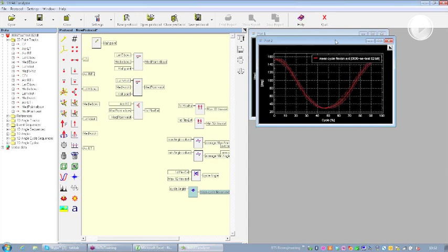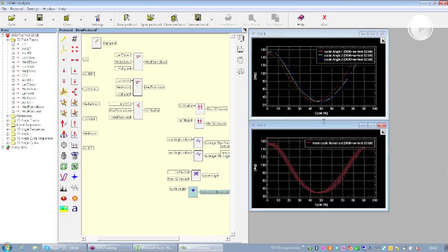That is going to be this. So the average cycle coming from the 3 cycles that we have due to the fact that we have a certain number of events. Okay, so you can see that we have the average cycle and the standard deviation around the line.